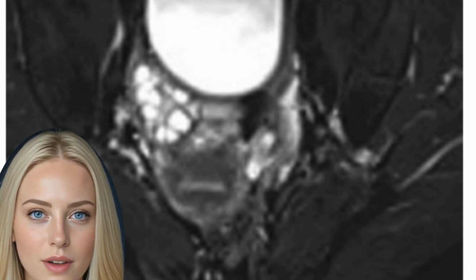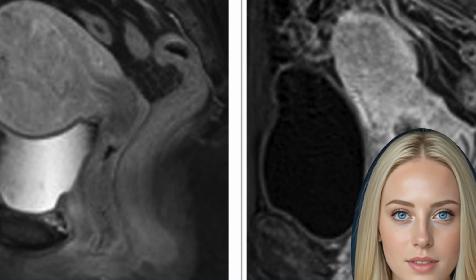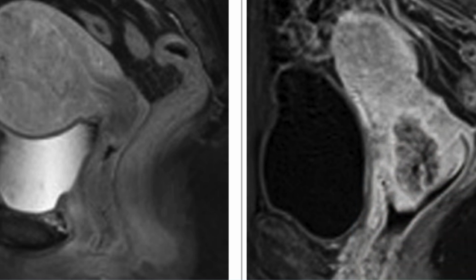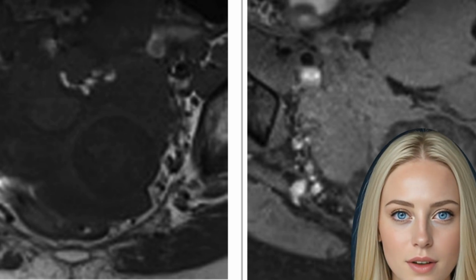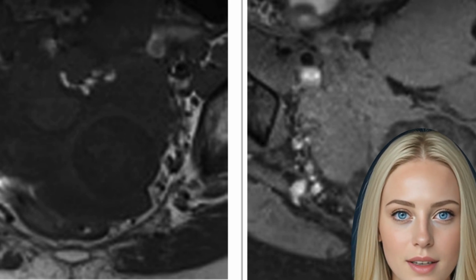High cellularity and cell membrane integrity restrict water mobility and therefore diffusion, as seen e.g. in tumors. During MR performance, diffusion sensitivity can easily be varied by changing the b value used during image acquisition. Quantitative analysis of diffusion may be performed by obtaining and mapping apparent diffusion coefficient, ADC, values for the evaluation of inflammation or fistulas. T2WI with fat saturation are helpful, especially with patients where no contrast media application is possible.